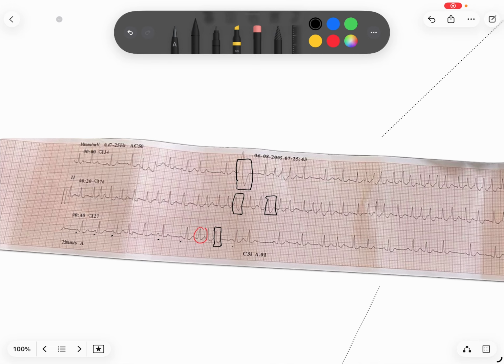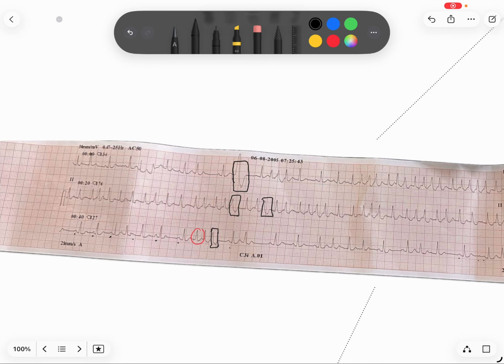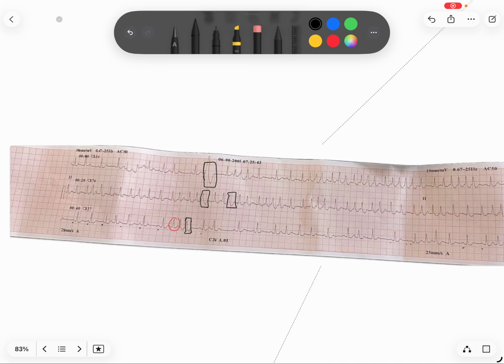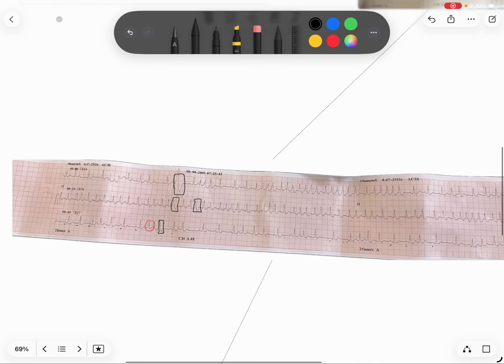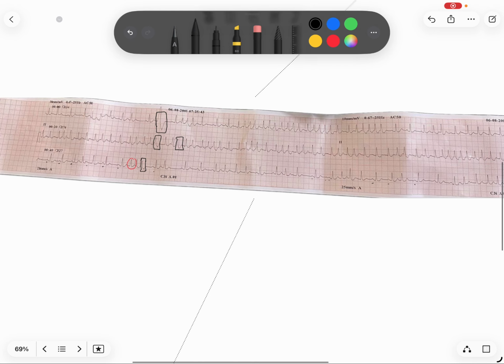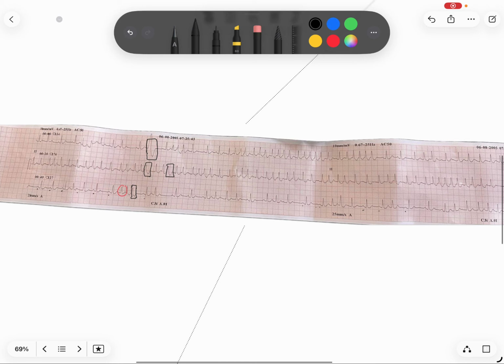So this can be called multifocal atrial tachycardia with multiple ectopics coming from the junction system and the ventricular system. It doesn't really have a clinical diagnosis as such, and if the patient has chest pain and other symptoms, at least according to my knowledge, I would suggest this patient go for an EP study and get a pacemaker implanted. But if I'm wrong, I hope our cardiologists will correct me in this.